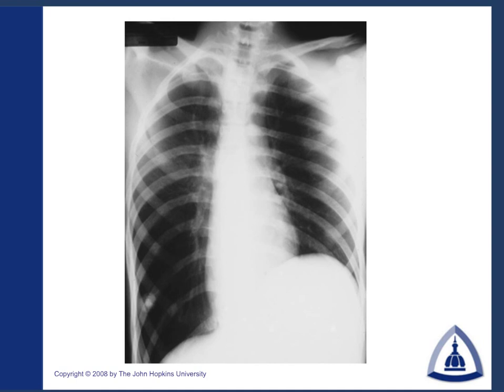This is a chest x-ray of a gentleman who lives on the eastern shore here. If you look closely down here in the right lower lobe, you see this 2-centimeter lesion with a central density. This is a bullseye or target lesion. The importance of this is it's small, less than 4 centimeters, not likely malignant. This bullseye or target pattern really suggests a benign process. This is a patient with histoplasmosis, so this was just an isolated histoplasmoma, and nothing should be done further about this.